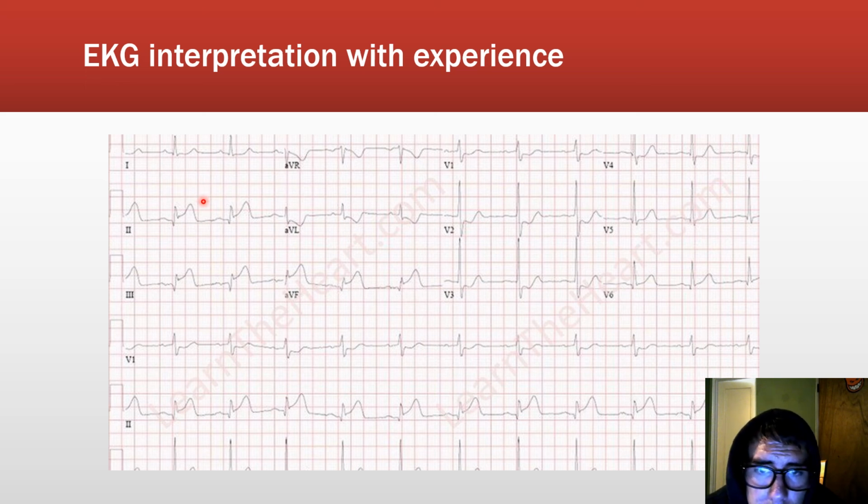So this one right here, this person is having a heart attack. They have a regular heart rate, regular heart rhythm. Rate is about, so rate's like in the 60s, low 60s, high 50s. It is regular. Our PR interval is long, so it's going to be a first degree AV block, no extra or missing P waves. And our QRS looks good.